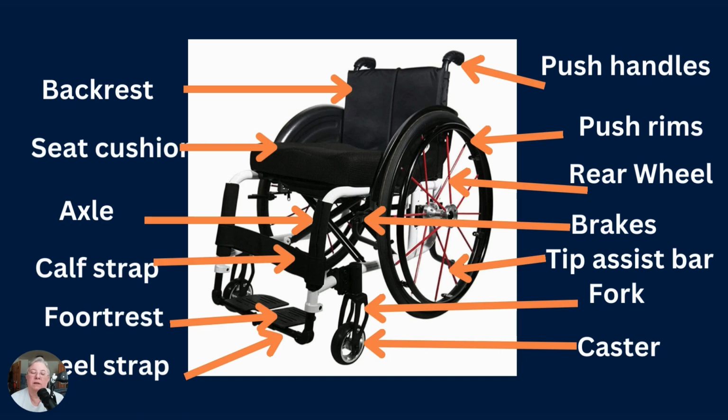So you'd have to talk to the store or to the garage in terms of your fork, if it's cracked, if it's loose. So that's the fork. That's not a word you would think of right away. You would think of a bar that holds the caster or something. It's called a fork, to eat with. I don't know.